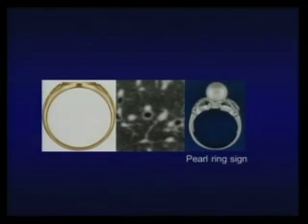And this is a bronchiectasis with the typical appearance of the bronchus that is dilated and the rounded opacity adjacent to it. So I think that is more proper. The proper name should be pearl ring sign because it's mimicking this particular ring.